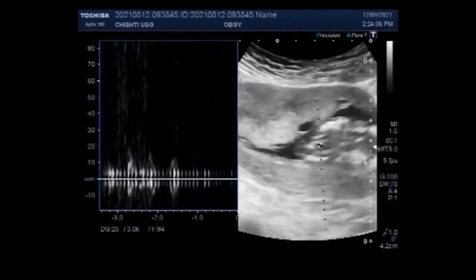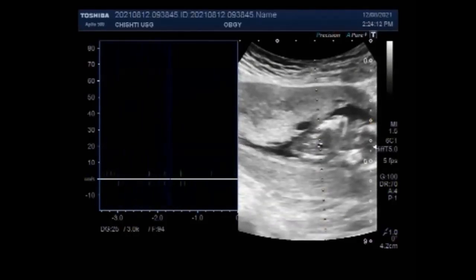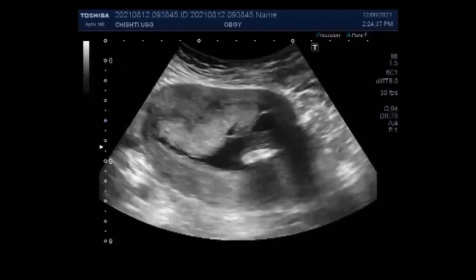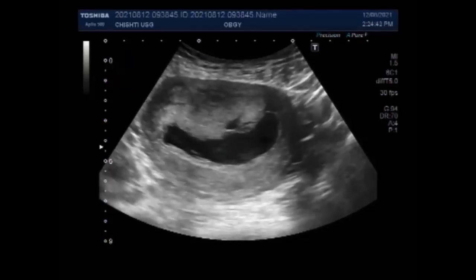A missed abortion is a non-viable intrauterine pregnancy that has been retained within the uterus without spontaneous abortion. Typically, no symptoms exist besides amenorrhea, and the patient finds out that the pregnancy stopped developing earlier when fetal heartbeats are not observed or heard at the appropriate time. An ultrasound usually confirms the diagnosis. In addition to signs of fetal life on sonography, subchorionic bleeding is an important factor affecting the outcome of gestation in patients with clinical threatened abortion.